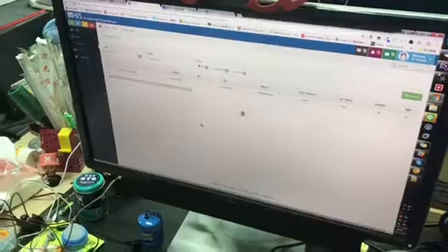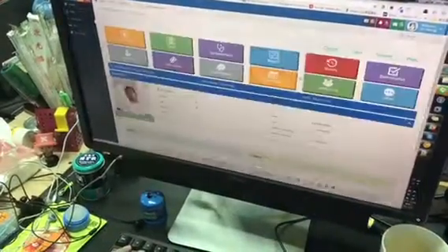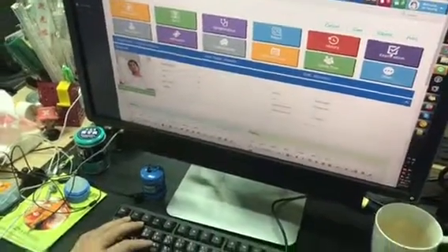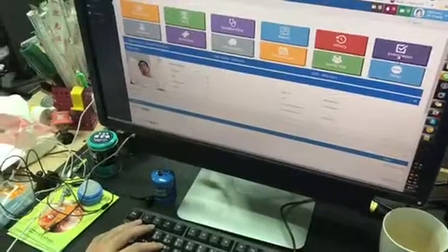Let's get back to the OPD system. Suppose after finishing the test, the result will come back to the OPD. So when the patient goes to the OPD, the doctor will see the result for the lab test.